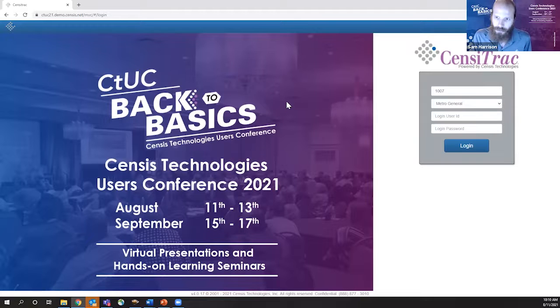We'll have an exercise sheet so you can go through the exercise. Today, what I'm going to show you is how we set all this up and create our scopes and our AER devices. Then this afternoon, you can go in and go through the exercise of processing a scope and get some hands-on experience yourself. This afternoon, when you log into the demo, this is what you'll see.